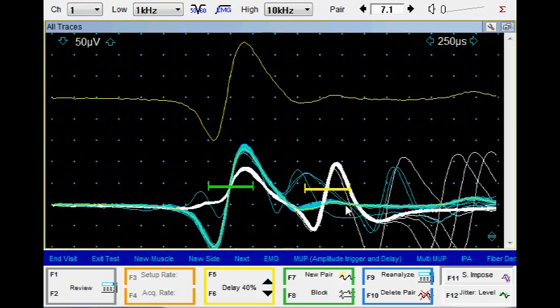Again, in the past, we had to go trace by trace to get rid of such interference. You will notice right away that in this recording, the discharges of the larger motor unit are already shown in blue color, and that's the color associated with traces that are rejected from analysis. We haven't done anything. The system has already rejected those traces. And how did it do that?